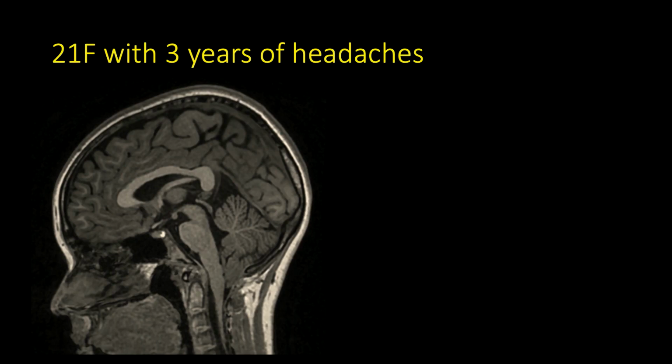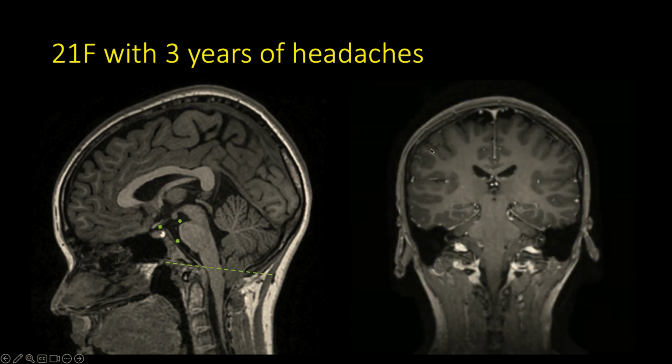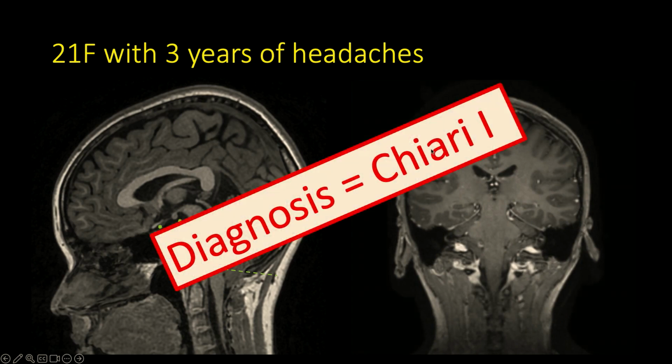Now, contrast that to this 21-year-old female with a 3-year history of headache. On the sagittal T1, at first glance, it looks very similar. Look at the tonsils, they're way down, they're peg-like, but then look at all of the basal cisterns. There's no narrowing between the chiasm and pituitary. Mammillopontine interval is good. There's no flattening of the pontine belly. And then we're going to check our post-contrast images. There's no pachymeningeal thickening and enhancement. So this indeed was a case of Chiari 1 malformation.